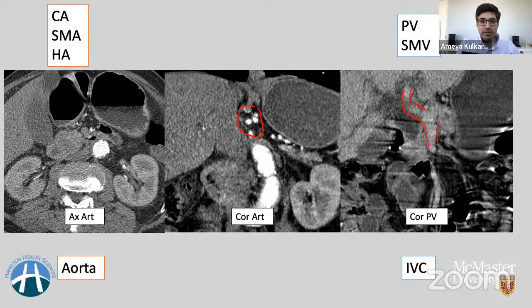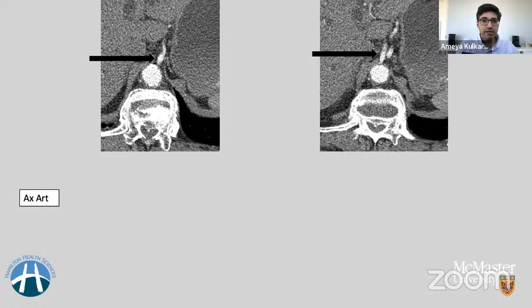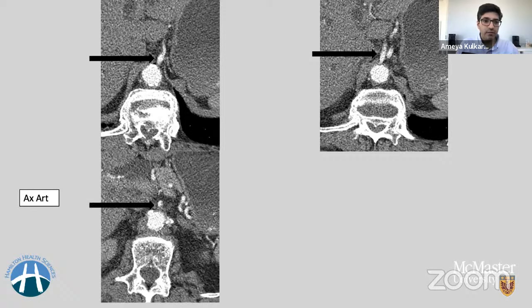So this tumor was deemed resectable, but this case has one really important finding, which we talked about in the last case. What about these vascular variants? Let's see what vascular variants we do have here. The first branch coming from the ventral abdominal aorta, which is the first major branch of our interest, is nothing but your left gastric and splenic artery, which are arising directly from the aorta. Then the next branch you see here is nothing but the common hepatic artery, which is arising directly from the aorta. This common hepatic artery is giving the right and left hepatic arteries as well as the GDA. And then as you go down, what is happening in this case is that that's the SMA, which has a separate origin.